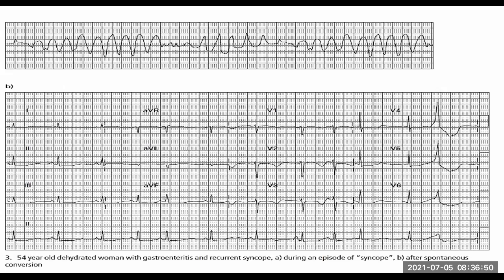Then if we look at the lateral side of the heart, we've got V5, V6, and 1 and AVL. V5 and V6 sit here, and then 1 and AVL basically look at the heart from there. So they're sort of forming a crisscross. They're looking at the heart from 4 different aspects, but they're all looking at the lateral border. So V5 and V6 are your lateral leads, and leads 1 and AVL are called your high lateral leads. We expect them to give a similar sort of picture.